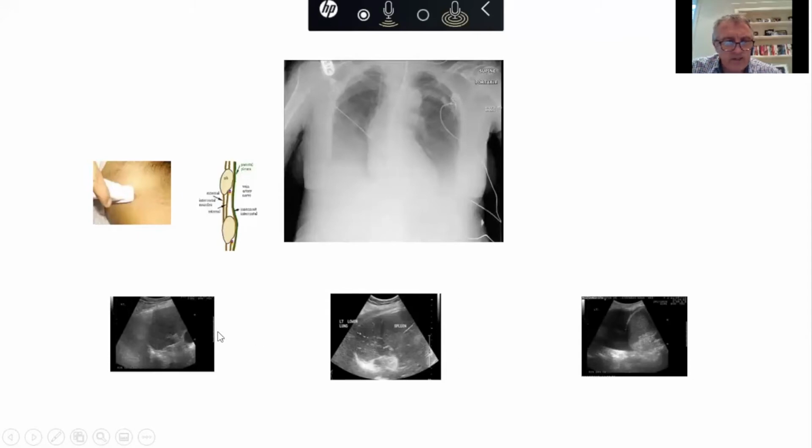There's no real image here, or rather, there is an image of fluid, but there are no internal echoes because fluid transmits ultrasound waves, whereas this is spleen here. This is grey because it transmits and reflects and produces this grey echogenicity.